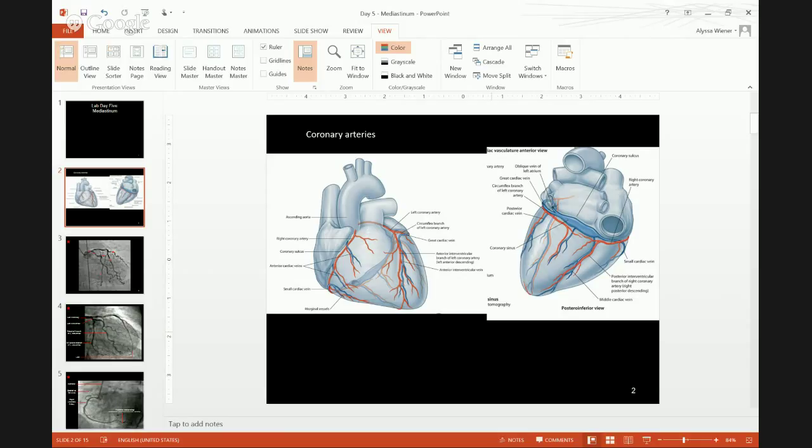In lab we talked about what CT slices are superior and what are inferior. So here you should be able to put them in order. What is superior and inferior? Remember, use your bony landmarks. Use where you're seeing your heart to say what is superior and what is inferior, or cranial to caudal, as this one says. So if we're thinking of what is the most cranial, what number would that be? So most cranial is going to be number 1.